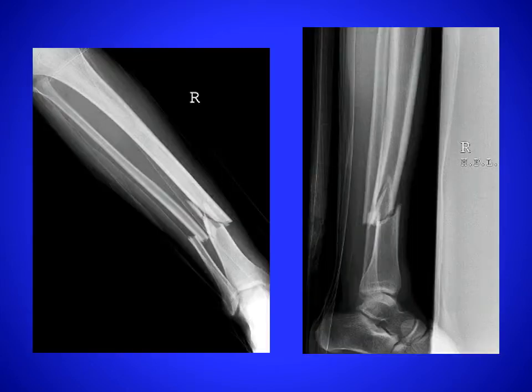From here we're moving on to the lower limb. Fibula and tibia are tightly connected by ligaments at the proximal and distal end, and so form a ring. To break a ring, you always have to have two disruptions. This could either be bony or ligamentous. This X-ray shows tibial and fibular shaft fractures.